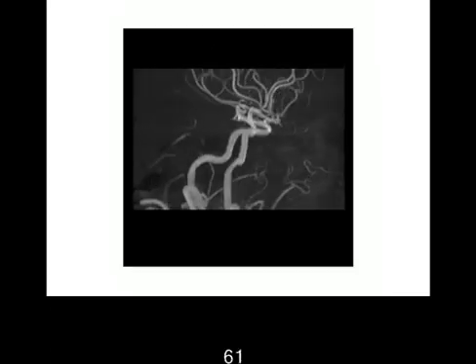This is an artery, an MR angiogram of the arterial system. This is the anterior circulation. This patient has a left side ophthalmic artery aneurysm. An aneurysm can rupture, especially when it's larger. So we have to watch this, and if it's big enough, we have to treat it either by surgery or by putting a coil in, blocking it from the inside.